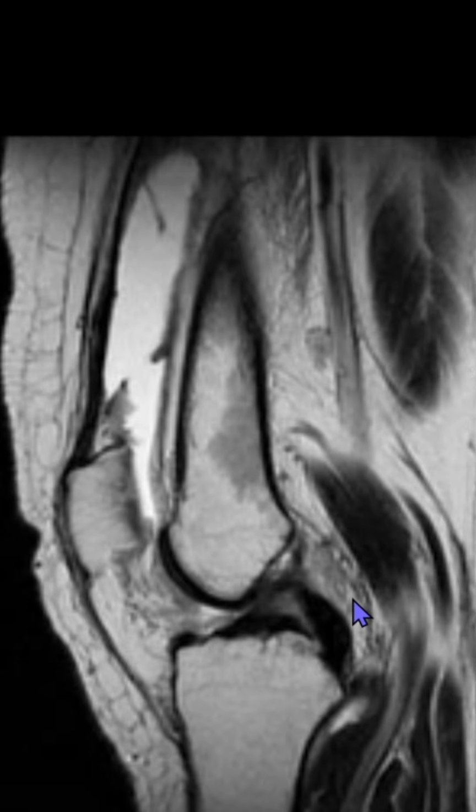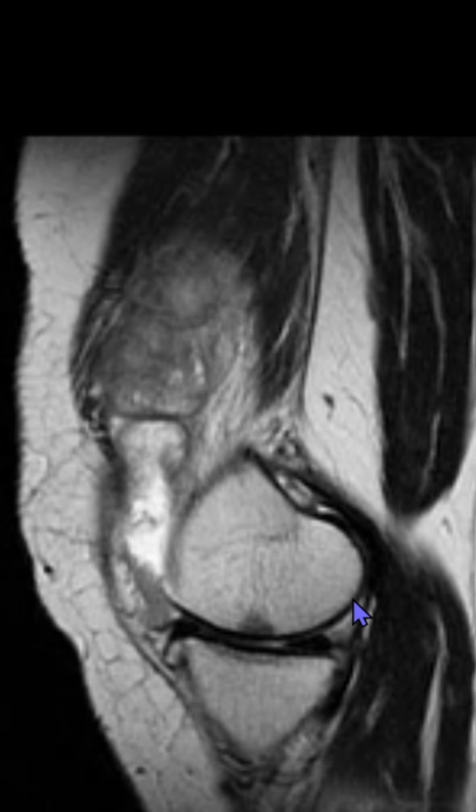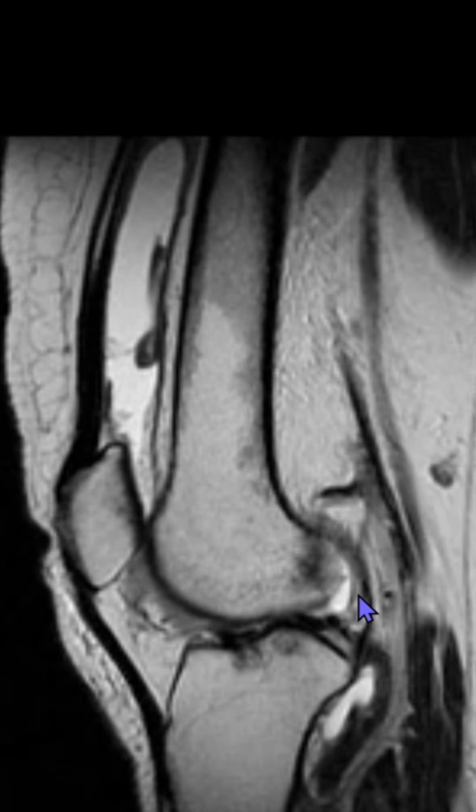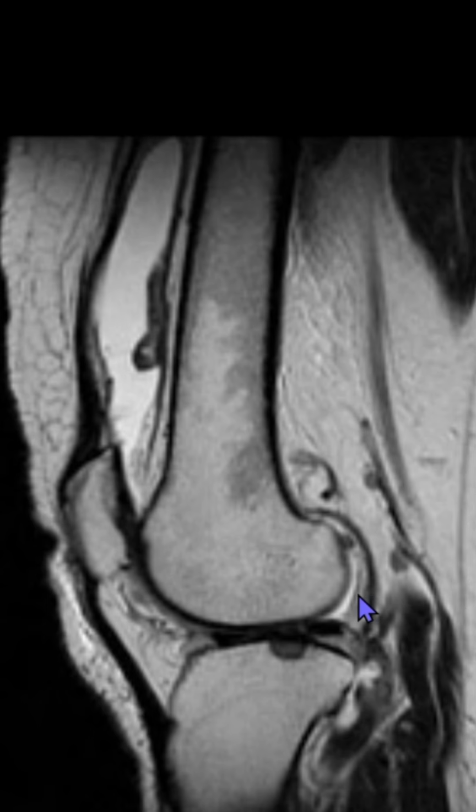Secondary synovitis occurs whenever there are severe degenerative changes. For example, the patient might have undergone a radial tear of the meniscus, there might have been severe mucoid degeneration of the ACL, and in such cases when this goes on for a long period of time, then we should suspect that there is some kind of secondary or reactive synovitis which has started to occur.